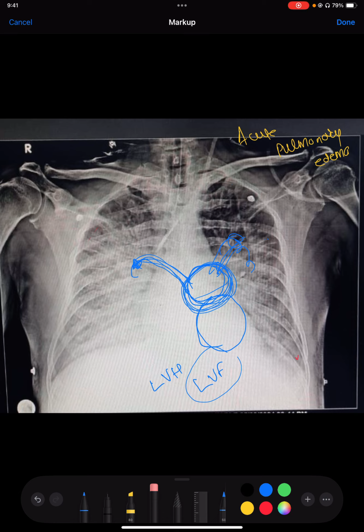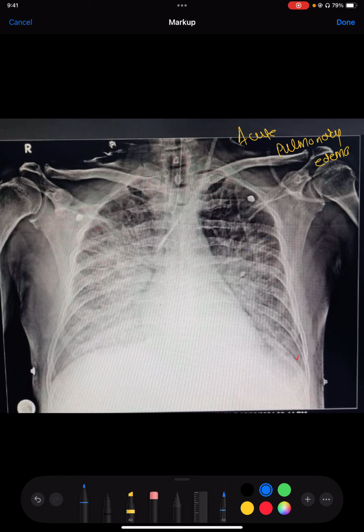That is the reason why the lung alveoli and interstitium are significantly filled or congested with blood, with fluids. If lungs are crystal clear, with no congestion of fluid in the alveoli or interstitium, they will appear radiolucent. But if the interstitium and alveoli are filled with water, X-rays cannot pass through that portion and they automatically appear dense white.